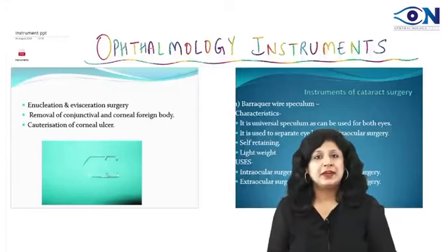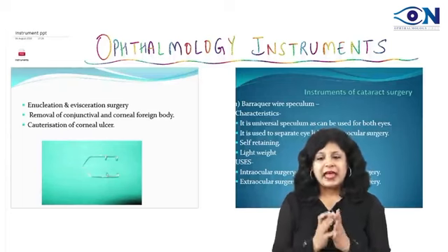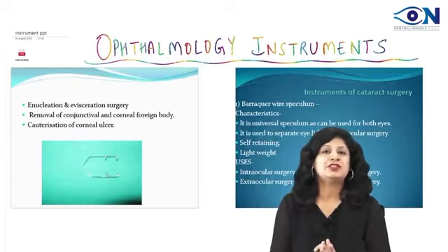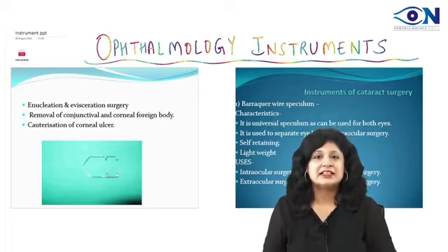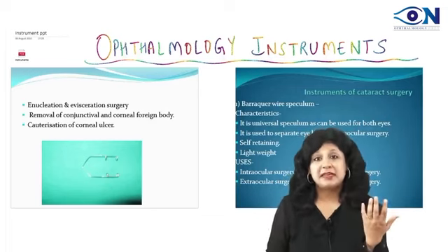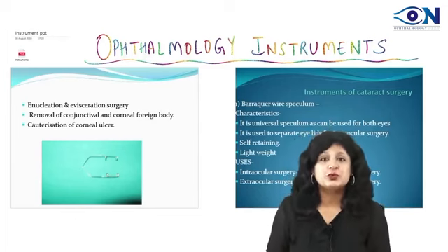So today we are going to deal with the ophthalmology instruments, and my purpose to deal with the ophthalmology instruments is dual. Like you know that so many times in the practicals and the viva these instruments are kept, and you have been asked to identify the instruments and you have to tell its uses.